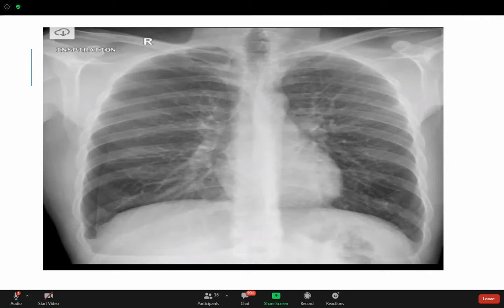Okay, guys, what do you see in the X-ray? So what's the clinical context suggesting? I mean, without looking at the X-ray, a clinical presentation suggesting what diagnosis? A young patient presented with a right chest pain followed by shortness of breath. What does this presentation suggest?